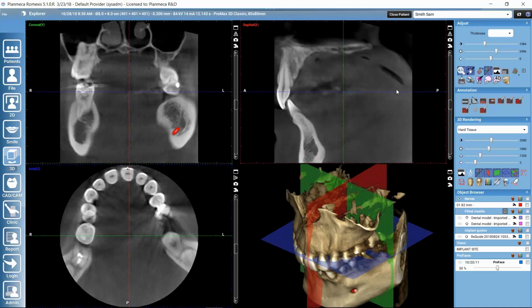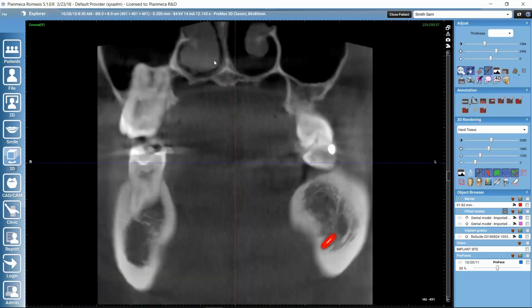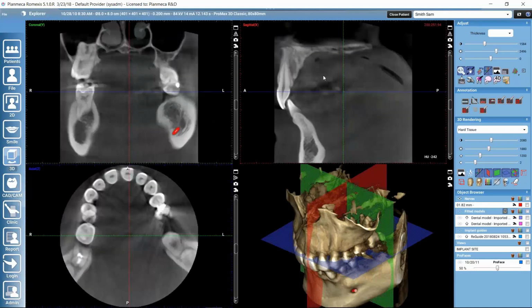And we can adjust this layout a little bit. For example, if you would like to see this coronal view bigger, we can maximize it. Each of these views has some controls next to them, so we could use this first button here for maximizing the coronal view on the whole space available for viewing the images. Or then we can minimize it back. And furthermore, we can also determine how many slices of this coronal view, for example, we would be viewing simultaneously.